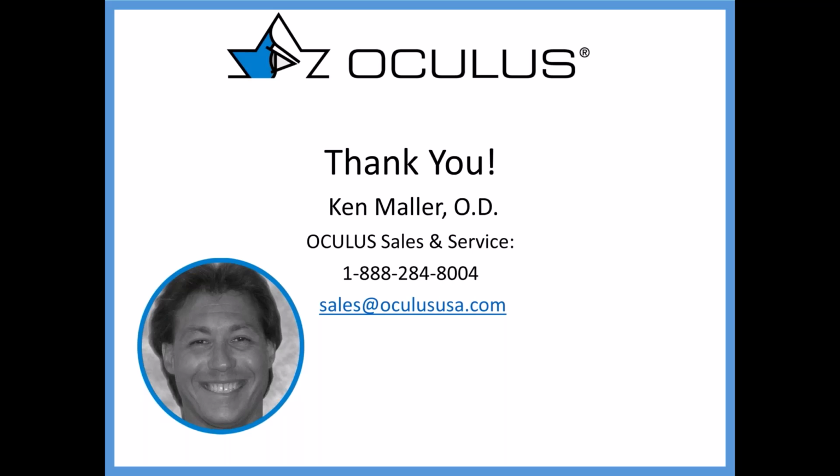Absolutely, Bill. What I found on the Wave screen, and again, this is following the philosophy of how I design the lens, so if you design the lens differently, your sinking may be different. So this is normative data based on what I typically do. And I noticed when I first started designing the Wave lenses, and I would see, for example, 350 microns of apical clearance on the Wave screen, I would invariably end up with a lens that was too close to the cornea, somewhere around 50 to 75 microns. And I didn't really like that.